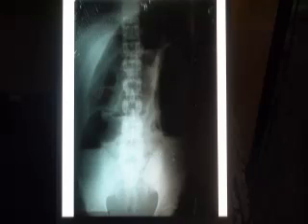Now we are going to discuss this type of X-ray. You can see here hugely dilated colon with two loops of colon and this is the mesentery in between, so it's called omega shaped colon, or three lines, one, two, three lines radiating down to the pelvis, called sigmoid volvulus, and it is one of the causes of intestinal obstruction.